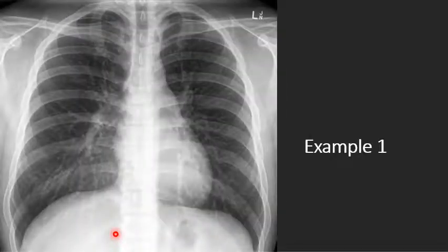All right, so let's go over example 1. When we go through here, I'm going to use the ABCDE method. That's the one I'm most familiar with. So if you go down, you start with the airway, look at the trachea. You can see here with your mind's eye, here's the bronchi, both right and left. I'll draw it out for us. So we come down here and we see that this is going to be the carina and the bronchi, and it goes up.